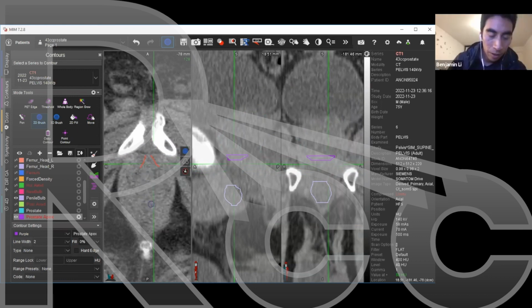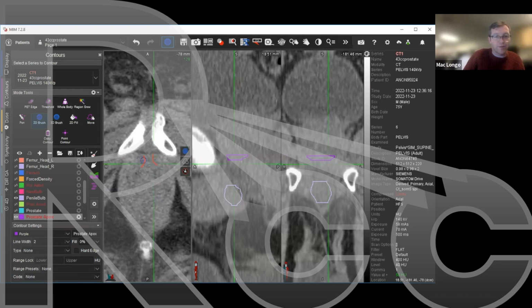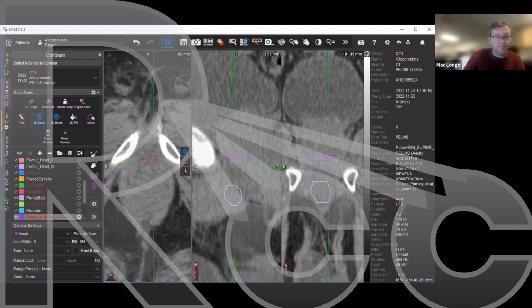And we can describe this line as either concave or convex, I think. And the hourglass shape is when it starts to not look like this and it starts to look more like this. So when you see the convex shape more inferiorly, that's where it's the urethra passing through that muscular diaphragm, that GU diaphragm.